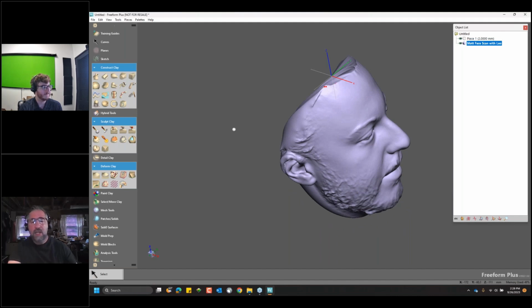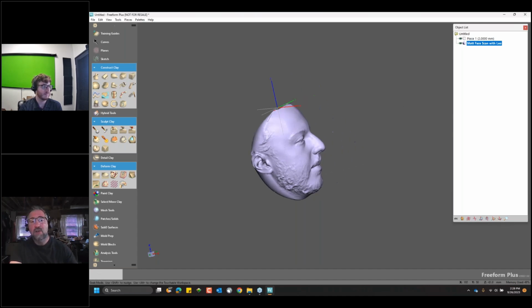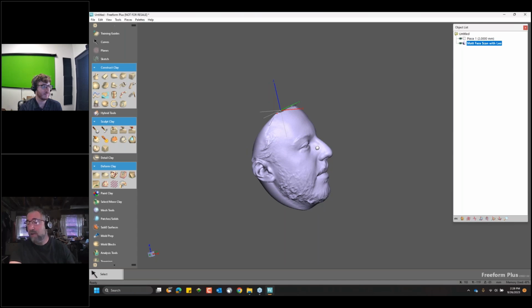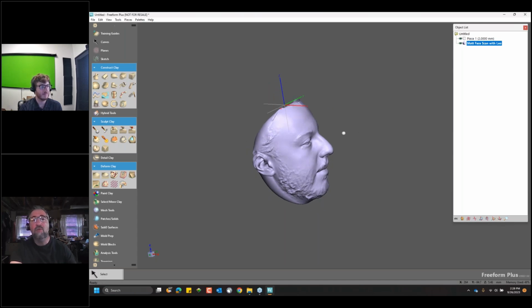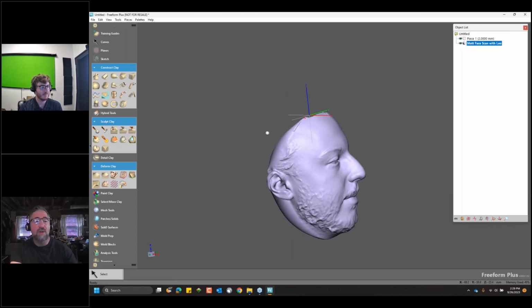One thing that is very common when you use a 3D scanner, the data will be aligned either directly in the center of the world, or sometimes it's actually offset depending on the scanner and how it's processed, where it may be relative to where it was scanned. So if you start a scan and your arm is somewhere off in space compared to where the device thought the center of the world was, you have to reconcile getting your data into an appropriate location.